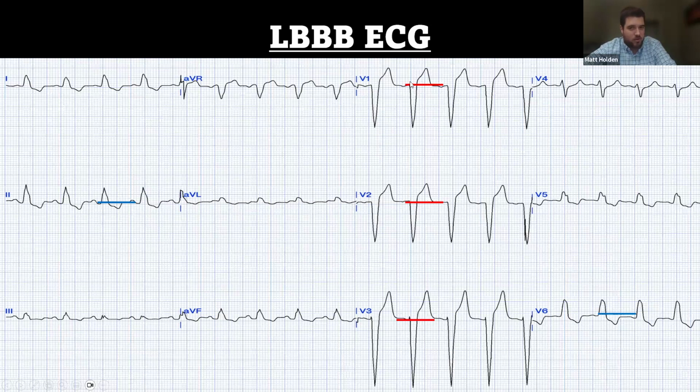If you're ever worried about the proportionality of something, you always got to remember the Smith-Sgarbossa criteria. Count your elevation here and then divide it by your S wave in millimeters. And that should give you a number. And if it's greater than 0.25, then you should be kind of concerned. I've only probably seen 2 left bundle branch block morphologies that met the Smith-Sgarbossa criteria. So it's not super common, but it's just something to look out for.